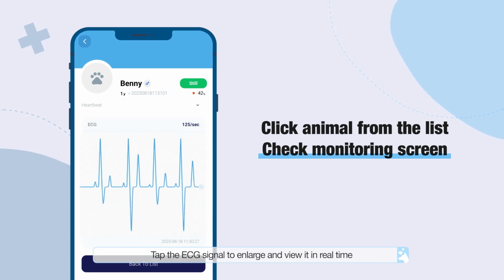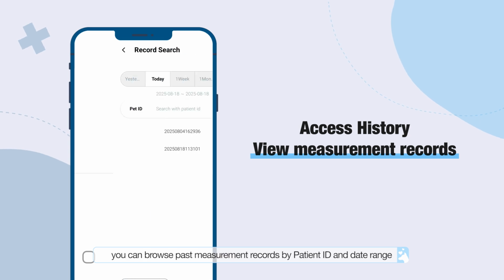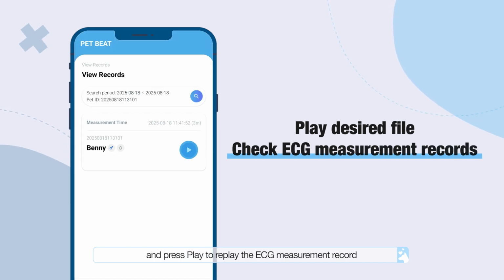Tap the ECG signal to enlarge and view it in real time. From the History tab at the bottom of the home screen, you can browse past measurement records by patient ID and date range. Select the file you want and press play to replay the ECG measurement record.